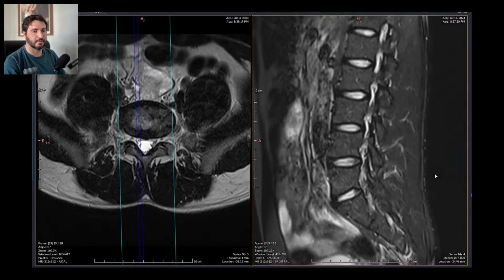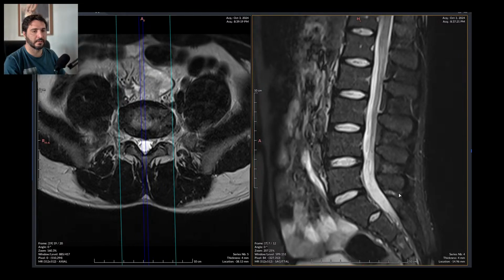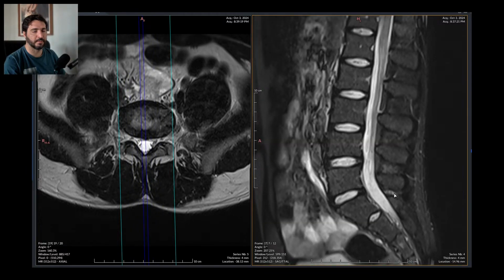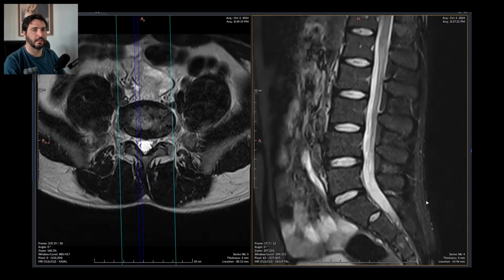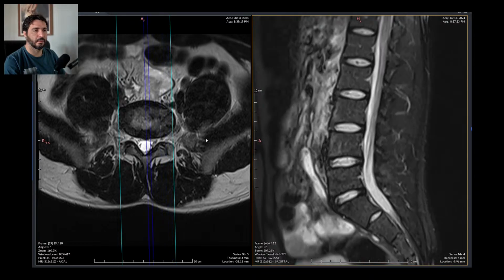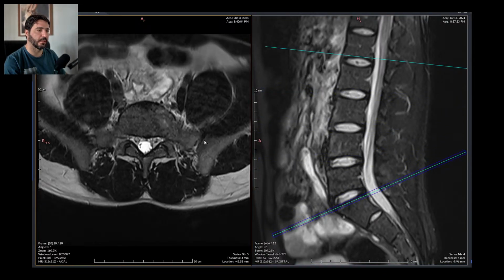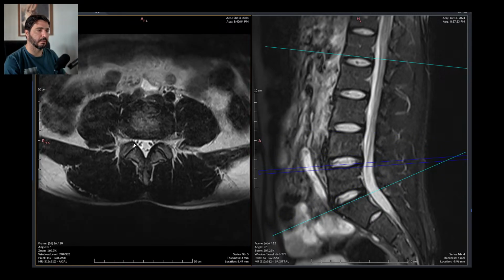On L5S1, not much, but there is most probably an edema of the interspinal ligament right there on L5S1. So this is also painful and it could be a justification, a motive for the patient's complaints.